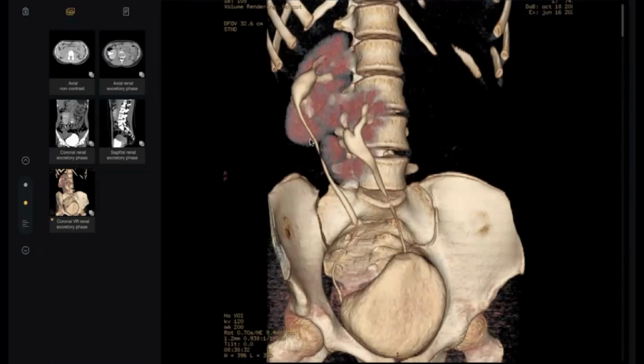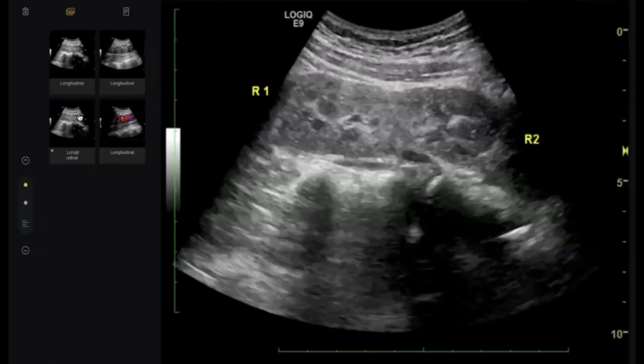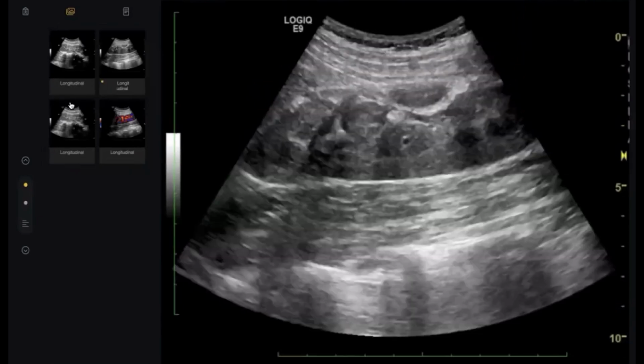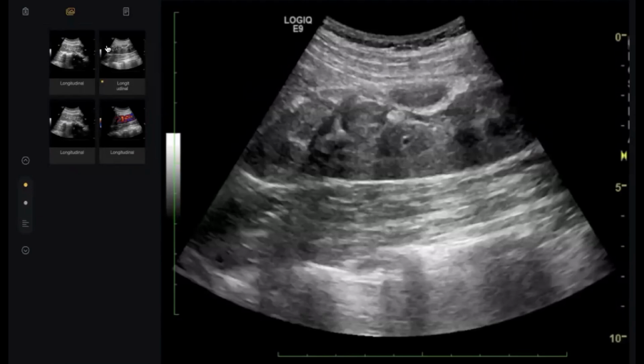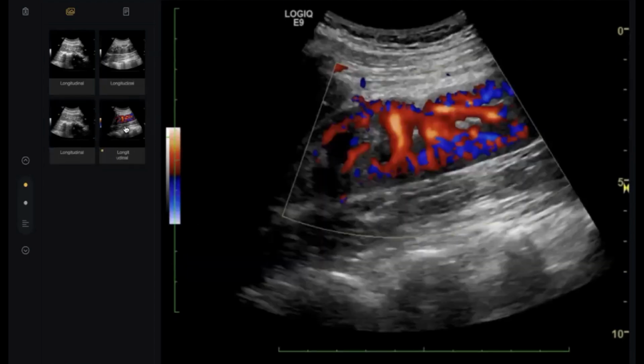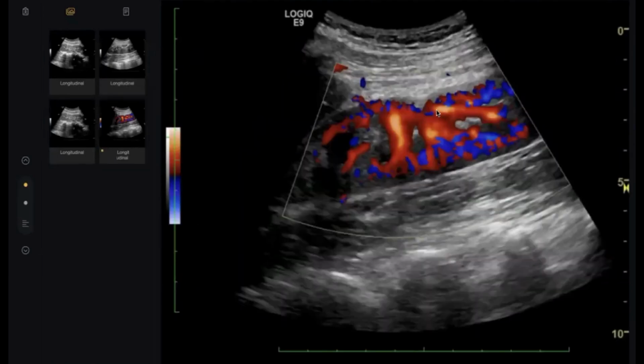Why do I bring this case? We must guess, my colleague. The examiner gives a case with no label, so you don't know where the side is. Here it looks like two fused kidneys: one complete and another partially imaged, fused together in this image. In another case it looks like only one kidney, and here there is malrotation. The Doppler confirmed it.